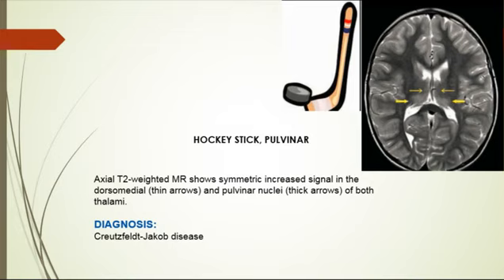On the MRI, there is rapidly progressive signal abnormality of the basal ganglia, thalami, and cerebral cortex. T2 hyperintensity and reduced diffusion can be seen in the pulvinar and the dorsomedial nuclei of the thalamus, what's called the hockey stick appearance that you can see here. You can see this hockey stick here, just looks like that. This is the hockey stick, okay?